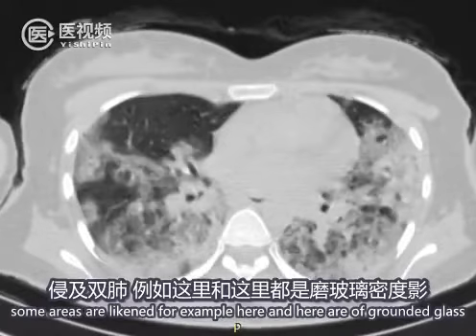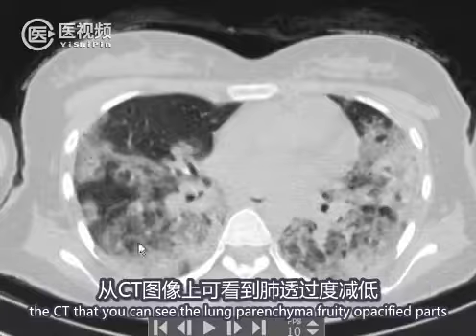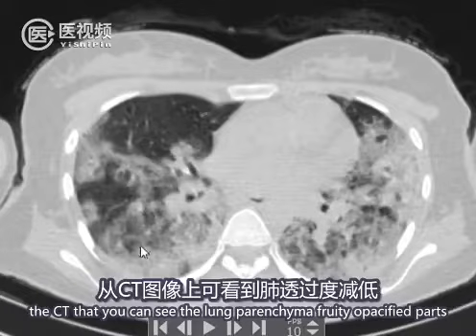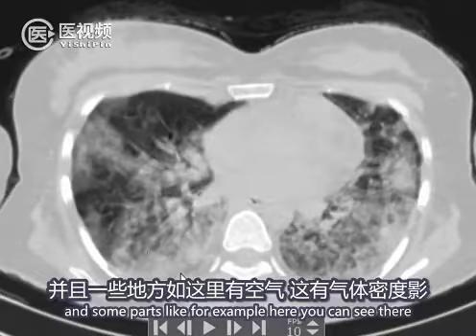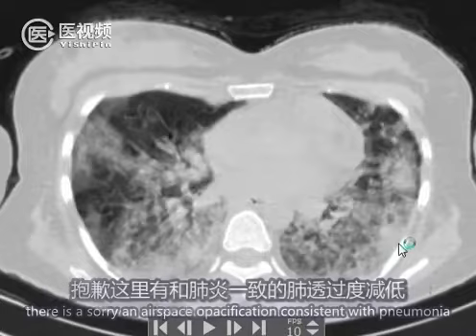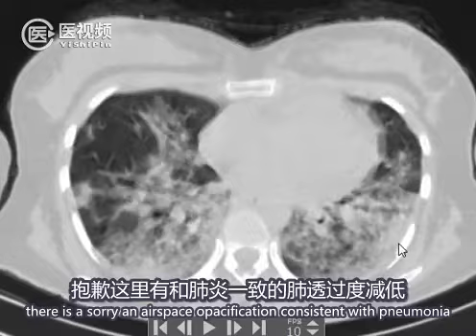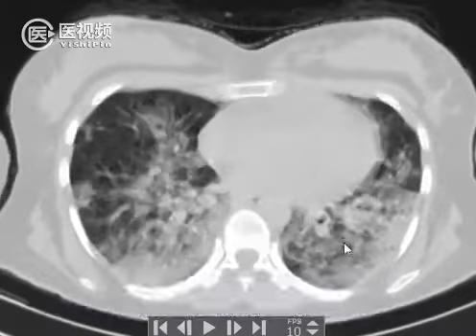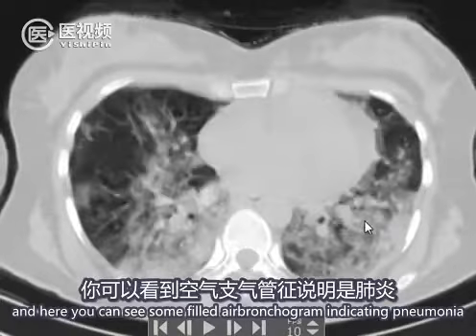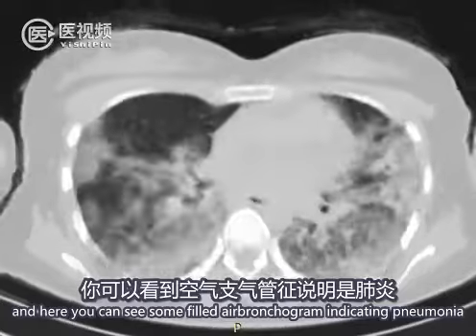Some areas, for example here and here, are of ground glass density, where you can see the lung parenchyma through the opacified parts, and some parts, for example here, show airspace opacification consistent with pneumonia. Even some bronchograms are seen here and there, like here and here. You can see some faint air bronchograms indicating pneumonia.